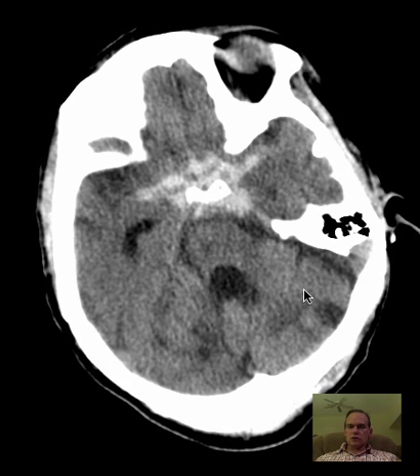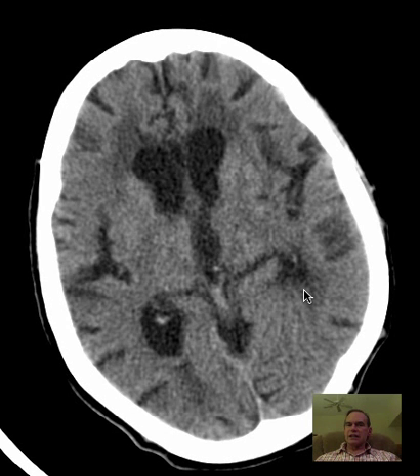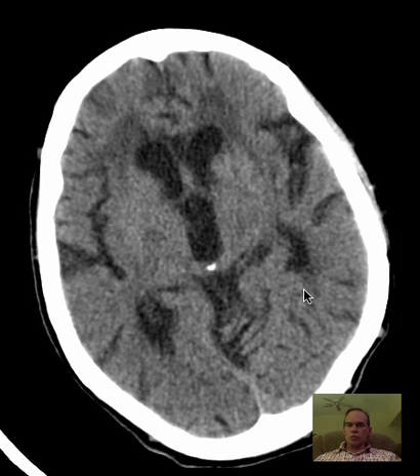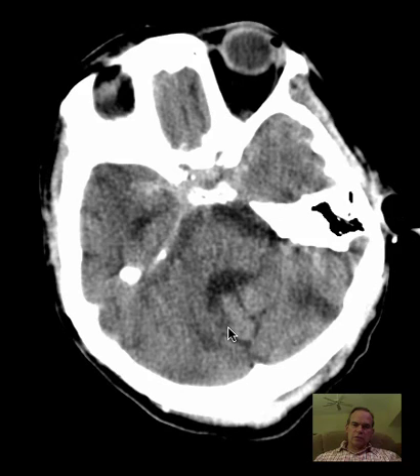We just describe them in this general manner because we don't know for sure in any given case exactly what they are, and it's always possible there's something less common that would not be known based on the patient's clinical presentation or history. We also have some chronic infarcts in the cerebellum.